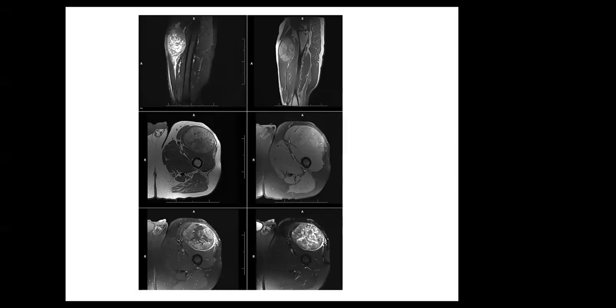Calcification will help you if this patient had calcification on the radiograph. You could say, if there was calcification, this is most likely synovial sarcoma, because synovial sarcomas tend to calcify on radiograph. But this one showed no calcification, so it could be any other type of sarcoma. So my question to you here, which is really the most important thing, is what is the role of MRI scan in this patient?